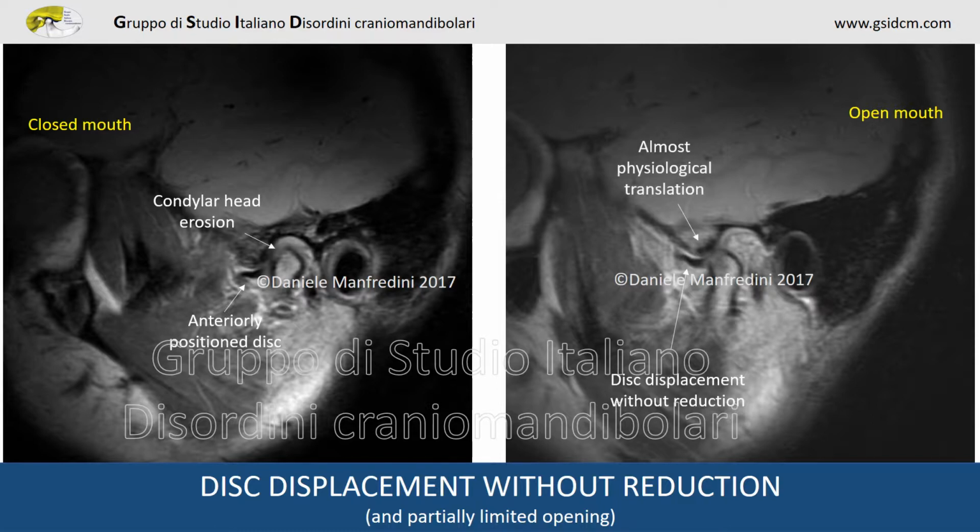Please note that the condylar head is affected by erosion and that, despite the obstacle of the disc, the translation of the mandibular condyle is almost physiological, and that's a rule. It is not necessarily limited by the obstacle of the temporomandibular joint disc.